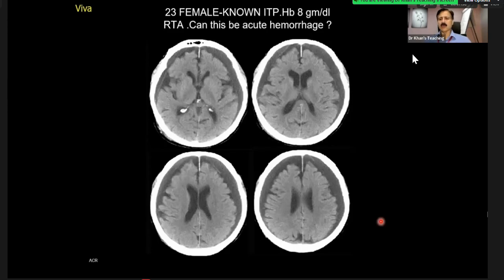And this is from literature, from the ACR, American College of Radiology, teaching files, that they have documented a case in which the hemoglobin was 8 grams per deciliter and acute hematomas were low density. So physics tells you this can happen. How can this case present in your life? For example, there is a case in Scotland, an offshore rig, and a patient had a head injury and other injuries, loss of blood, but the weather was not good. They are keeping the patient alive with a lot of IV fluids.